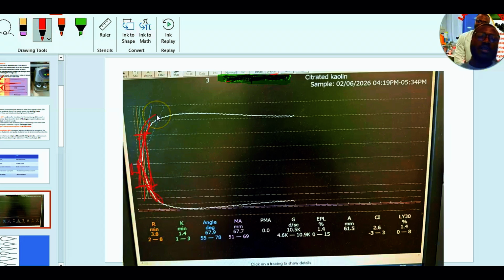very wide. Unlike another graph, though on this same horizontal axis, we could have a very slow trapping of platelets which can appear like this. Which means that when the clot initially began here, there were platelets gradually being trapped in here until we probably got to 20 millimeters wide, and from this time to the start here will be what?